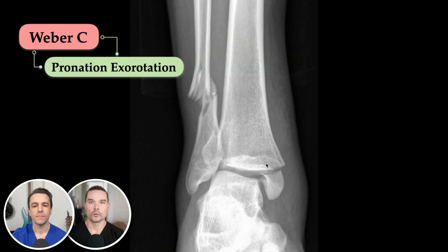So stage 1, we look at our medial malleolus. We have an avulsion fracture of our medial mal, and then we can also appreciate some subluxation of our talus laterally. And again, this is consistent with the criteria, right? Because those force vectors are going to be exorotation and lateral, driving up into the fibula, and that's why we get that proximal fibular fracture.